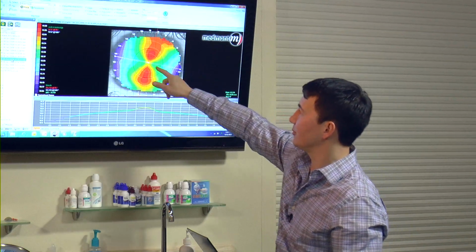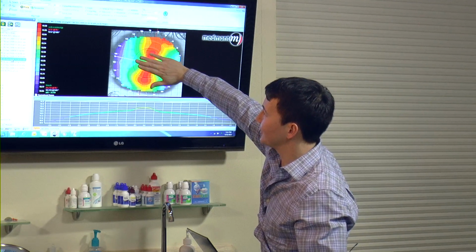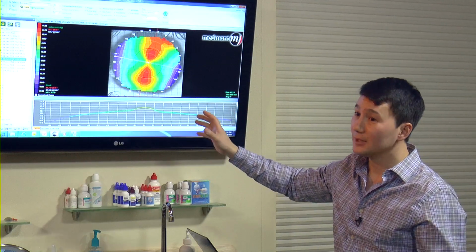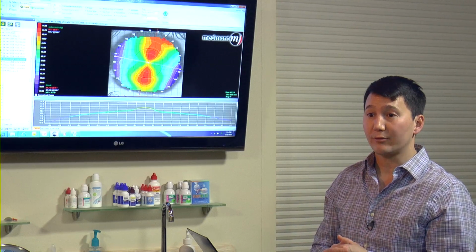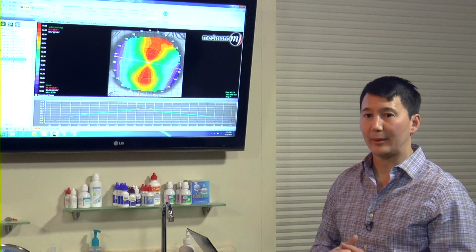It's obvious to see from our figure 8. It's very symmetrical within the pupil. That's a mirror of that. That is a mirror of that. So correcting this patient with spheral cylinder refraction, going to be pretty easy. This patient may not need a GP lens. This patient might do well with a soft toric because the eye is so symmetrical, and the axial map tells us that.